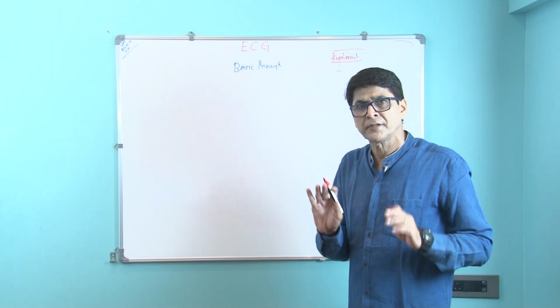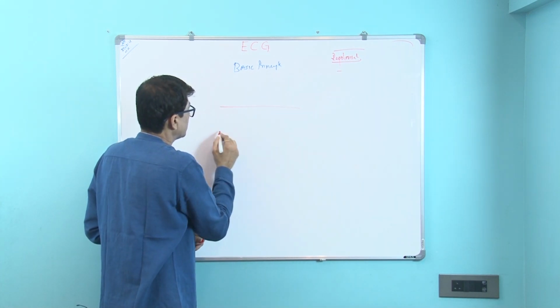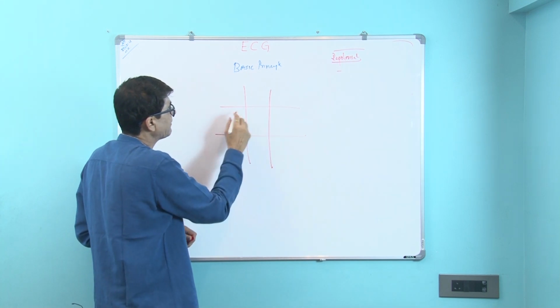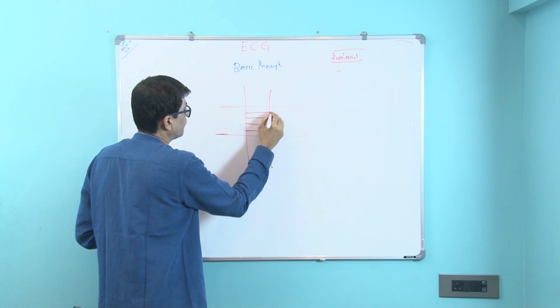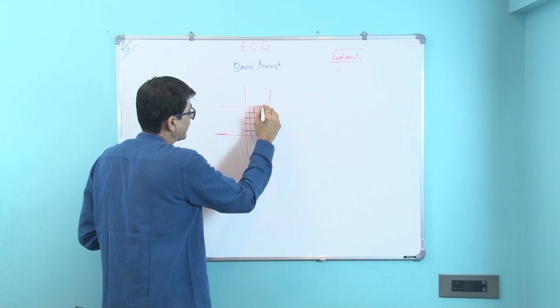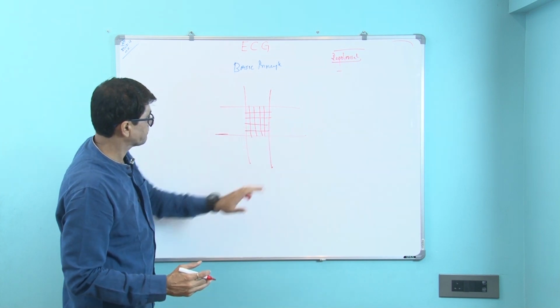We will talk about ECG paper. If you see ECG paper, and you must have already seen, there are big squares and there are small squares. One big square contains 25 small squares. So, throughout the ECG paper you will find this.